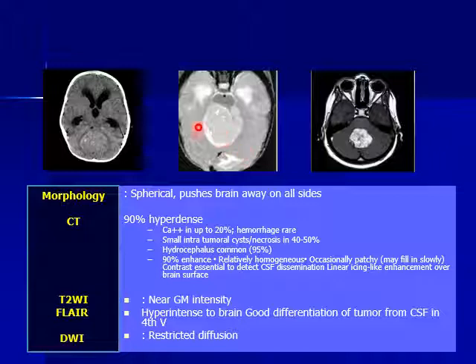And because this tumor is aggressive and very malignant, our colleagues in the Department of Oncology usually ask to examine the brain and the whole spine to detect CSF seeding. And you will see it in routine work. Patients with medulloblastoma or ependymoma are usually asked to perform whole spine or whole neuroaxis imaging with contrast to exclude CSF seeding. And as I've told you, because it's a highly packed, highly cellular tumor, it is restricted in diffusion.